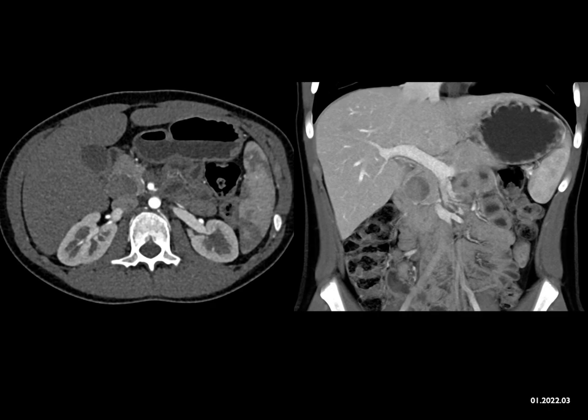Well, lymphoma can give you a mass in the pancreas. Usually it's diffuse infiltration and multi-organ involvement. And that hint about female and teenager doesn't help you with lymphoma. It doesn't look like pancreatic adenocarcinoma because we essentially never see pancreatic adenocarcinomas in 17-year-olds or teenagers. But also, we don't see a dilated common duct or pancreatic duct. That would not be the case.